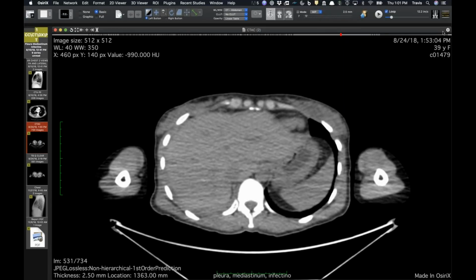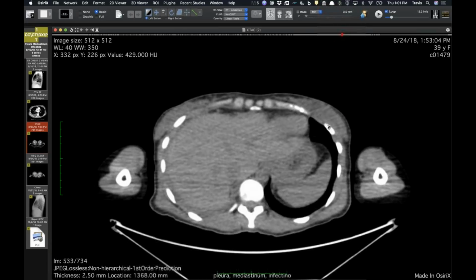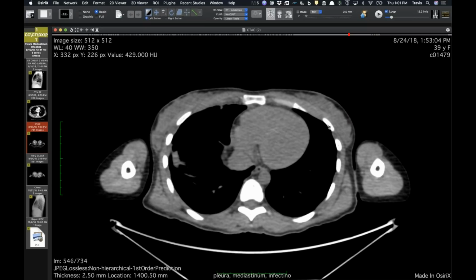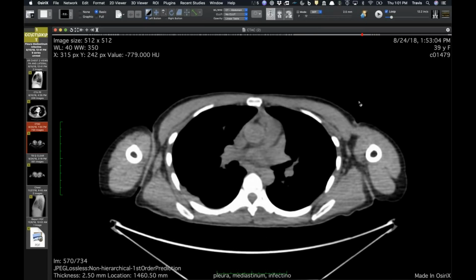Very impressive. But yeah, no, I only showed one duplicate case that I'm aware of today. But all right, now on, if I see pleural nodularity, it's crypto until proven otherwise. I'm going to stick with that. Crypto or TB, right? Unless there's a subtle mass in the breast, like Howard's case.